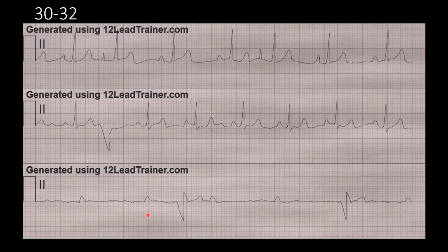And we do have P waves, so these are actually P waves. You might be mistaking them for just hard to see ventricular complexes. But remember, these aren't going to be PVCs really if these were ventricular complexes. So this right here is a ventricular complex, a premature ventricular complex. So that means these aren't, and once you look at them close enough, they look more like P waves.